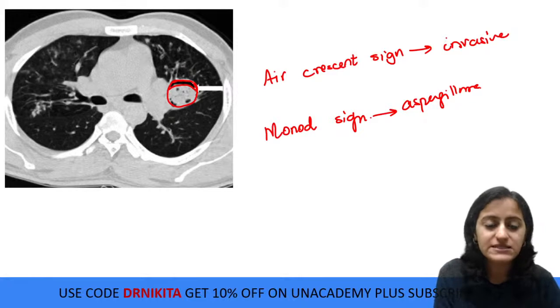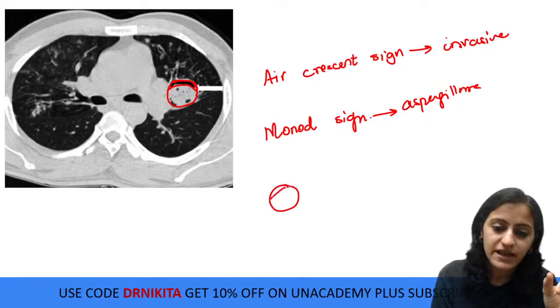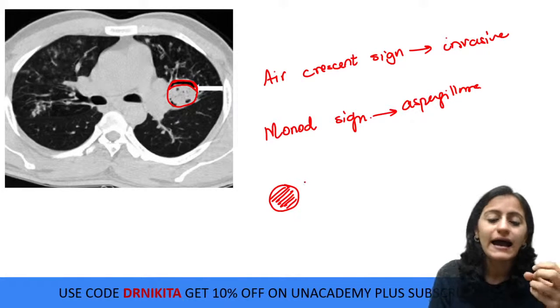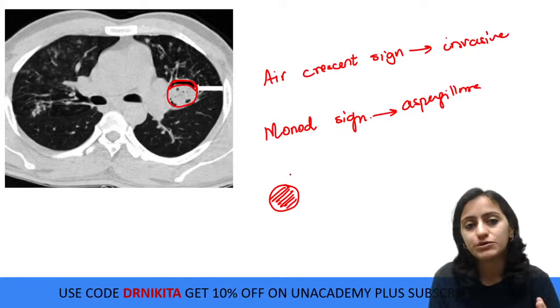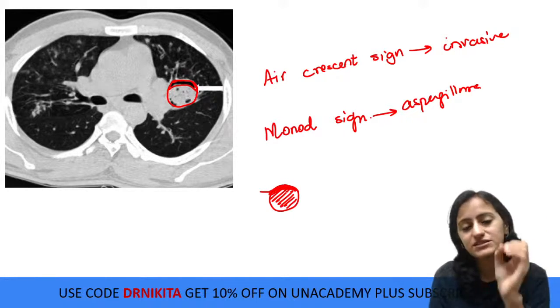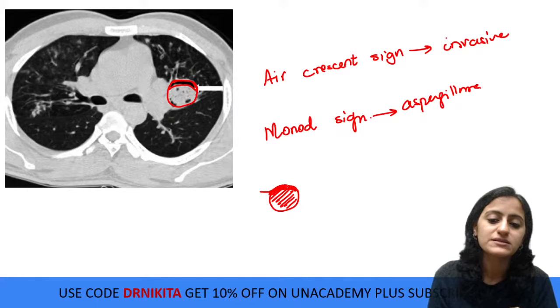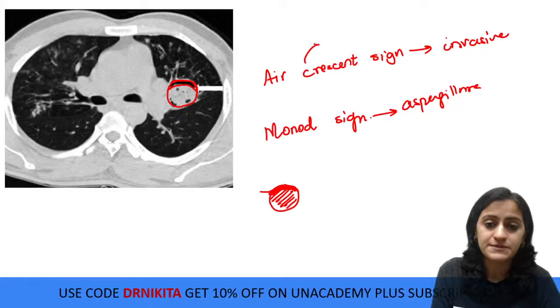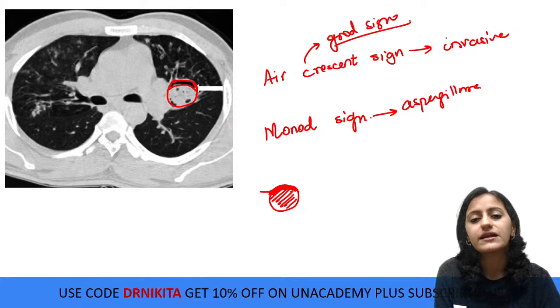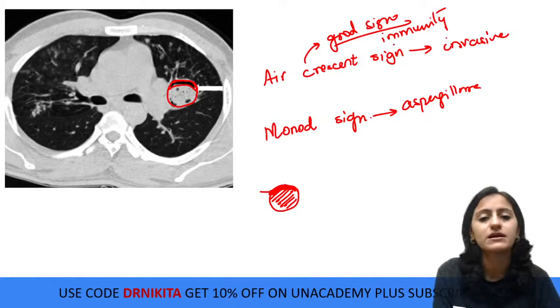So when you see this air crescent sign in angio-invasive aspergillosis, there is angio-invasion, there will be an infarct, and when the patient develops immunity, then there is this appearance of air. There is invasion of neutrophils, there is retraction of this nodule, and you will see the air crescent sign appearance. So this air crescent sign is basically a good sign in angio-invasive aspergillosis. It indicates that yes, the patient is developing immunity.